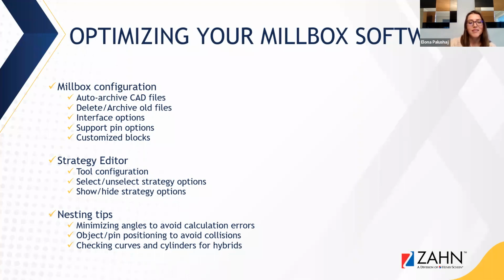So some of the features are auto-archiving your CAD files. We'll go over how to delete old files or archive them if you're nervous about deleting them. We'll cover some interface options that can be turned on or off to make your user interface more user-friendly and cleaner looking. We'll go over support pin options. There's a lot that can be automated there. I see a lot of times they're being changed manually, and customized blocks.